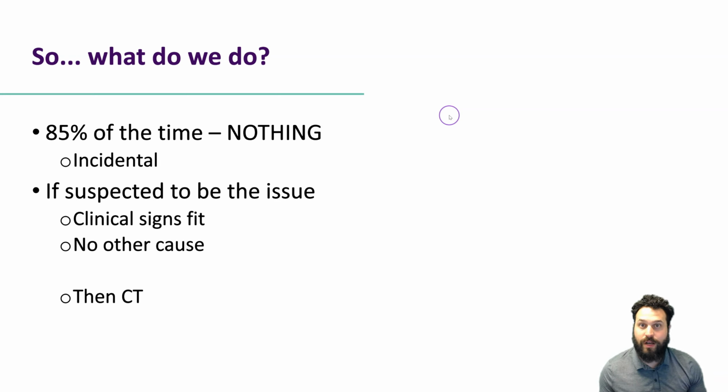So I hope this has been helpful in these kind of interesting cases. We're kind of wrapping up barbecue season for the year, but you never know when a patient's going to present because the migration happens anytime. And so next time you see one of these in practice, you can think to yourself, there's an 85% chance that this does not matter. And on the off chance that it does, my next step should be CT.